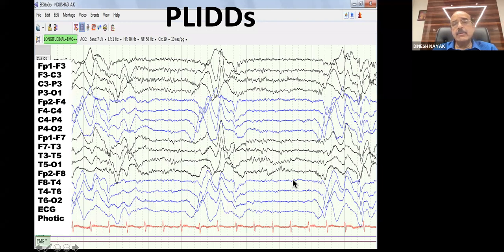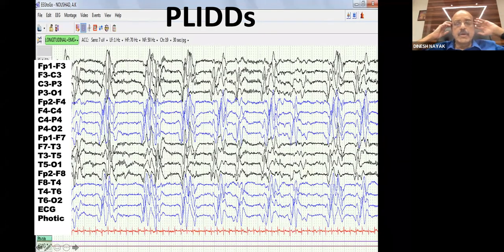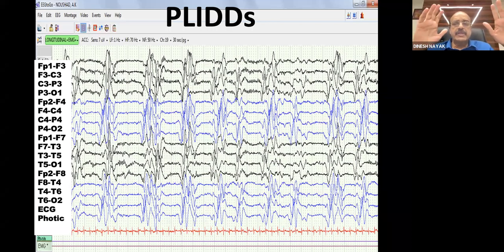And rarely you can get it at shorter intervals, but classically, SSPE is a slow wave diffuse discharge, which is usually long interval. So you have now seen in the generalized discharges themselves, spike and wave discharges with short interval, classical of anoxic encephalopathy. Then you saw sharp wave and slow wave, short interval, classical of CJD. Then you saw the slow wave bursts with the longer interval, which is of SSPE.